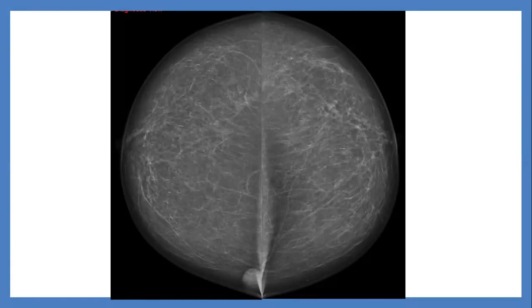What else supports it being a skin lesion? A subtle adjacent line, but only around one area or less than a quarter. The posterior portion is not clear, but at least from the border it is sharply demarcated, and subtle adjacent skin thickening is there.